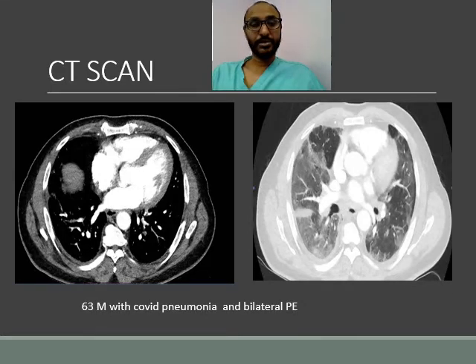COVID pneumonia may not be the only pathology causing patient symptoms. يعني يمكن الأعراض تكون لازم to look for associated things like the مريض هو typical COVID symptoms.